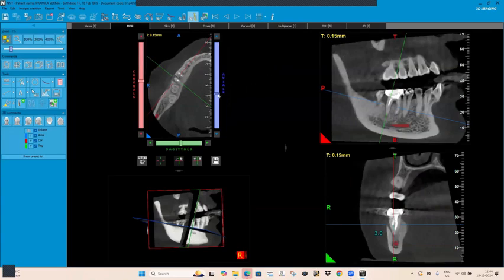We can apply the MAR filters, and second, we can use regular scans, not high resolution scans, to remove metal artifacts. Metal artifact reduction, that MAR effect, helps a lot in reducing these types of artifacts. That is one thing we can do. Yes, ma'am. And it helps. In routine practice also, I apply the MAR effect if these metal artifacts are very prevalent.